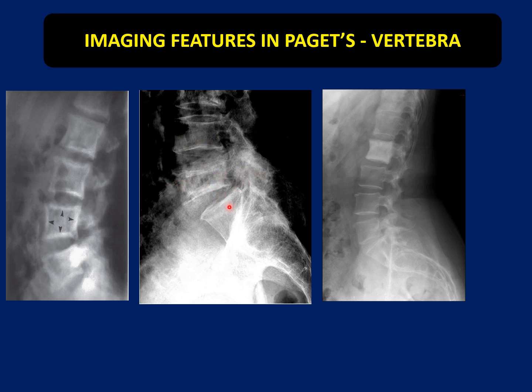Bone expansion is the most important feature in Paget's disease, which helps in differentiating it from other lytic sclerotic lesions. And when it is a predominantly blastic phase, we will get a typically sclerotic vertebra, which is called the ivory vertebra. When there is no bone expansion, there are multiple differentials, from tuberculosis, lymphoma, sclerotic metastasis, to Paget's disease. All these will be differentials for a solitary ivory vertebra.